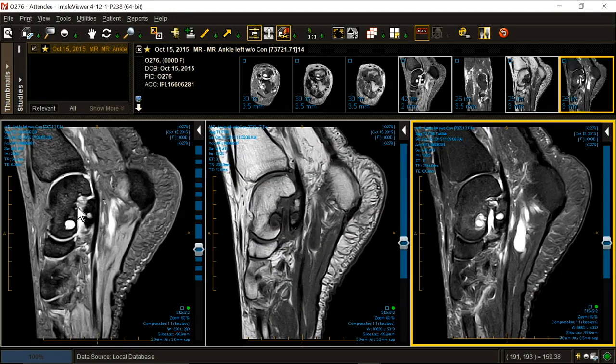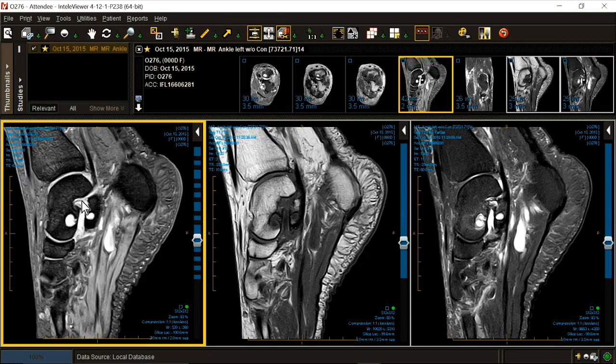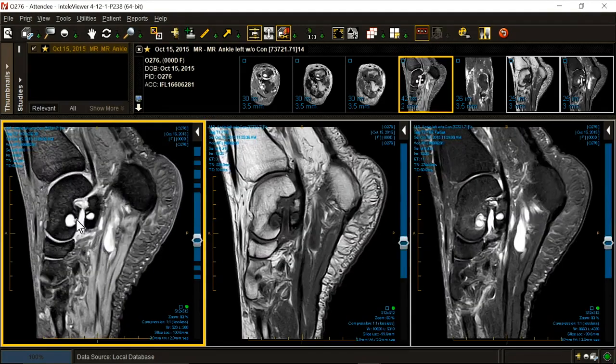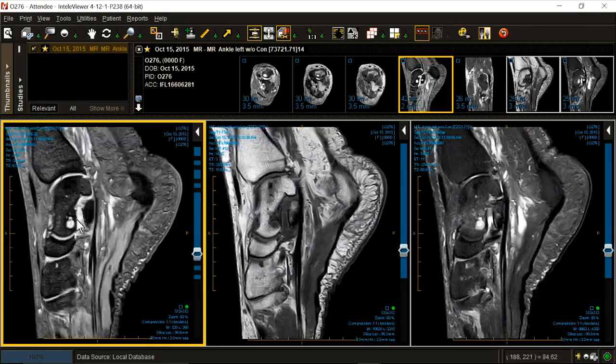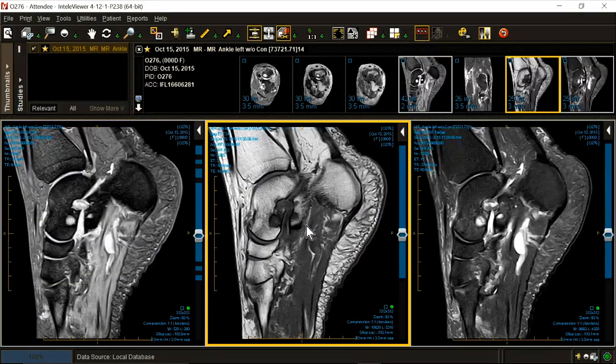On the left, a gradient echo, a detection sequence for tendons and ligaments, but like all gradient echoes, deficient in the medullary space, deficient in the assessment of enchondral or spongy bone. Yeah, it does show the cysts, I admit. In the middle, the T1.